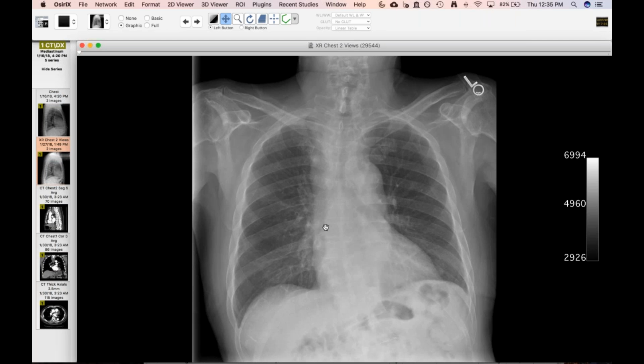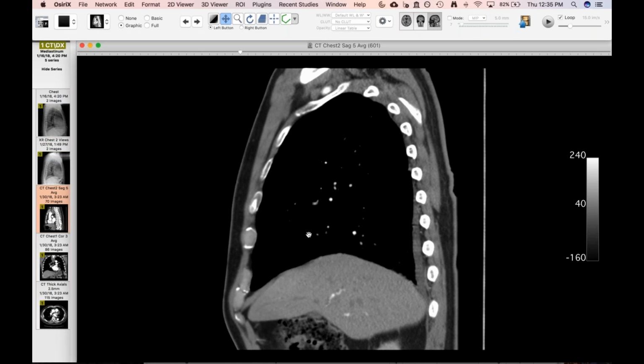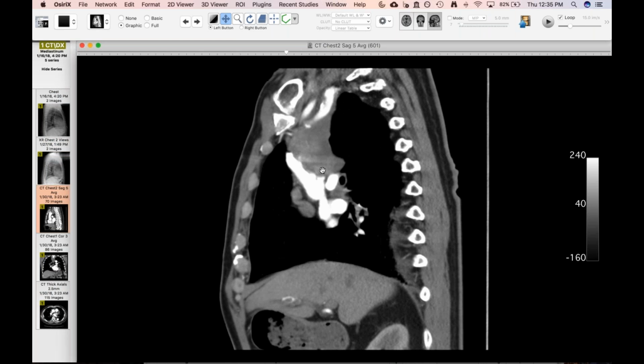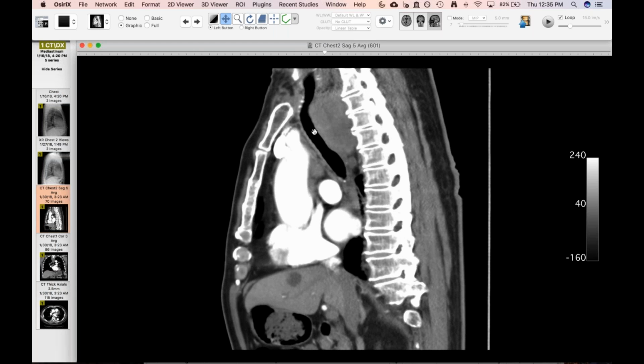Travis, what was the tumor? Your sound dropped out for a while. Oh, it was a primary esophageal tumor. Okay. It went from the proximal third of the esophagus. I don't remember if it was squamous cell, or probably, given the location, I don't know that for sure. And then there was just paratracheal metastatic disease and other nodes that were involved. But nice, you could just see the correlate with the radiograph of that anterior displacement of the trachea.